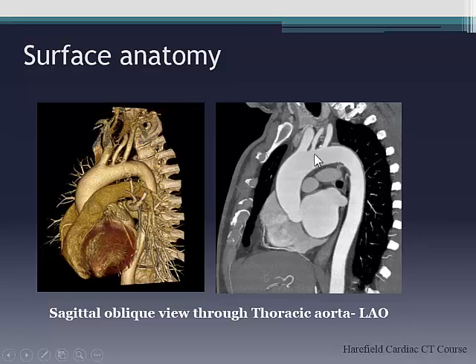So again, you can see the three vessels, and obviously the three vessels will vary. So where do the LIMA grafts, or where do the LIMA vessels, come off? Left subclavian, yeah. So the other thing to do, if you're reporting a graft study, is make sure that the left subclavian artery is patent and there isn't a critical stenosis there. I've seen a couple of cases like that.